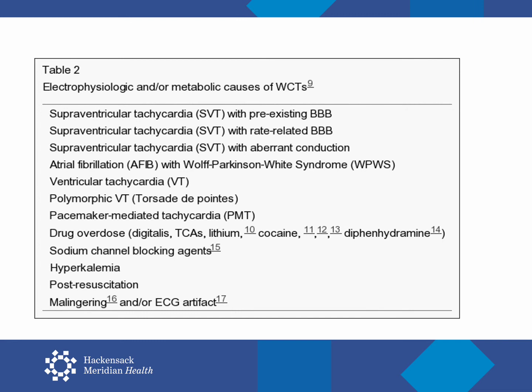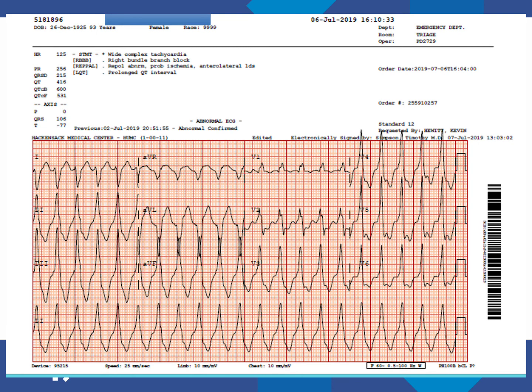It's not always obvious how to recognize ventricular tachycardia. Contrary to popular belief, a patient with VT can be relatively asymptomatic, sitting up, smiling, just feeling tired, right up until the moment that they become unresponsive or degenerate into fibrillation. Trust me, I have seen it happen. This patient, for instance, is sitting up, feeling generally okay, just a little tired. The machine reads a wide complex tachycardia and a right bundle branch block. Is this SVT with pre-existing or rate-related bundle branch, or is it a VT?